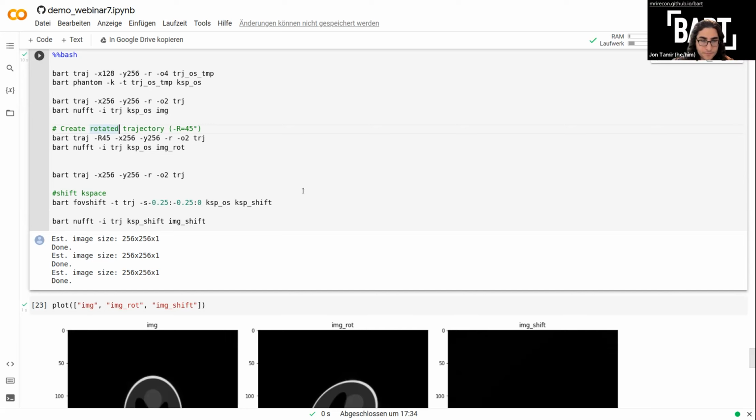Yeah, that's a good idea. Christian, do you want to make a comment? I want to say this is not yet really what the tool is supposed to be used for. It's shifting the entire k-space at once. If you want to shift parts of the k-space because you know exactly where your values should end up, then you can do it with this tool by splitting it up, but it's going to be a bit more difficult.